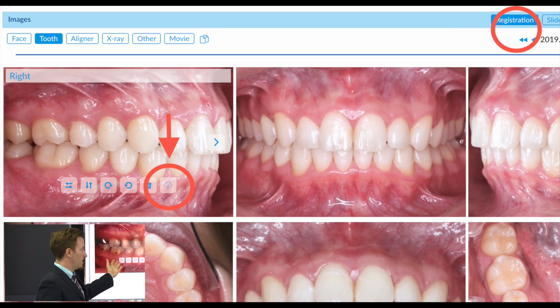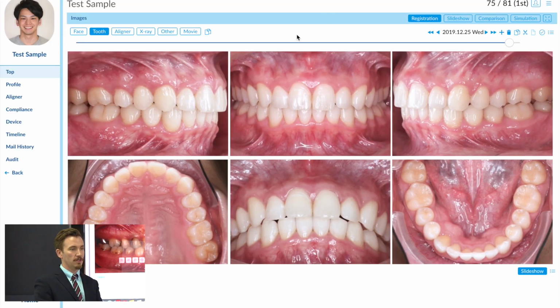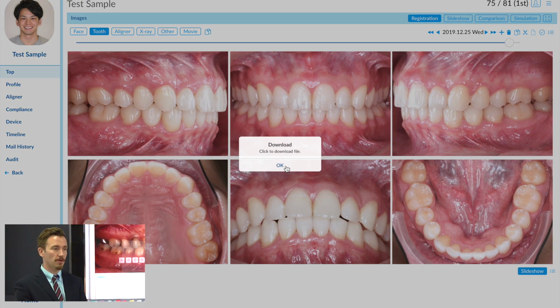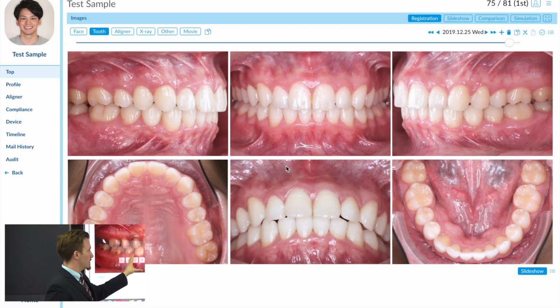Within the menu of each frame, the furthest right icon, the cloud icon, is a download icon. This will allow you to download any photos that you've uploaded to any device that has access to these photos. So if you'd like to save the photo on, say, your phone, and you've uploaded it from your computer, access the patient, access the photo, and download directly from here.